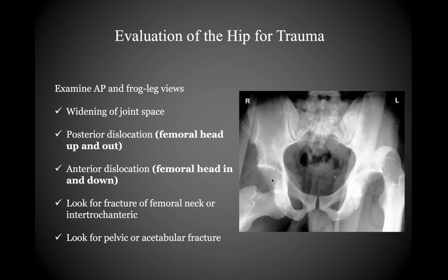You also want to evaluate the femoral neck and the intertrochanteric crest and line for any evidence of fracture there. And then you want to look at the pelvis as well, specifically the acetabulum, to assess for a fracture, which it does appear that there's a fracture here in this patient located right here.